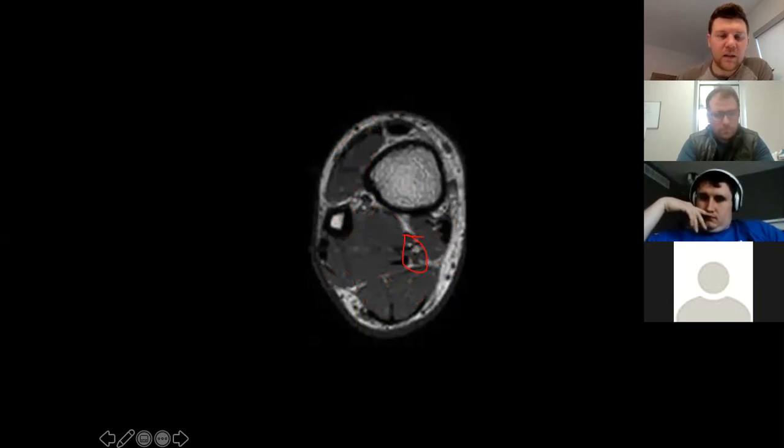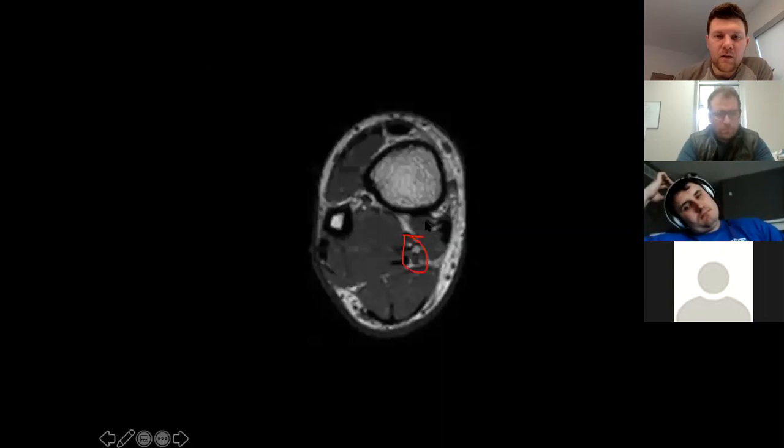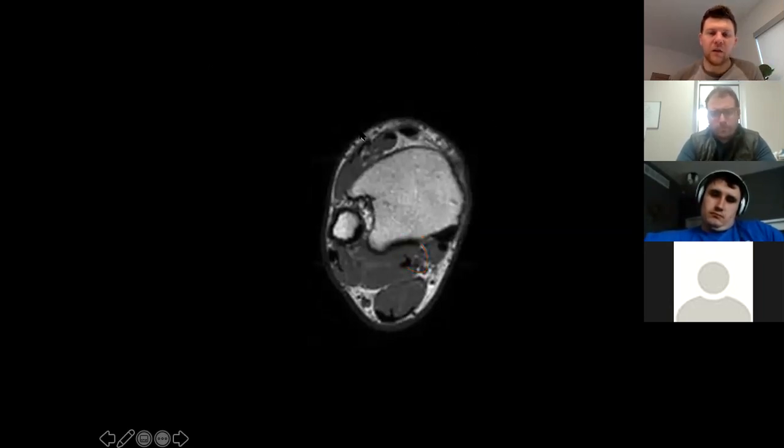Dr. Rosante, can I ask you a quick question? Absolutely. So just back to the lateral compartment, I was just used to the brevis always being closest to the fibula, but I guess at this level you're saying it's that thin, wispy thing most posterior. Let me clear my drawings here. We can do still shots, but sometimes it's easier to see scrolling, so let me get out of the annotation part here.